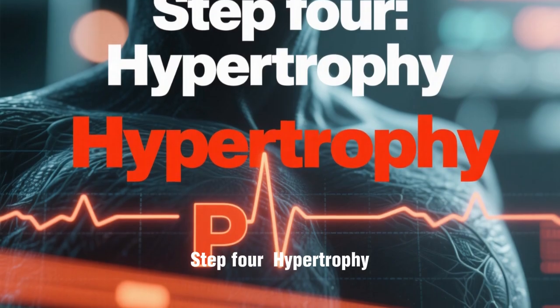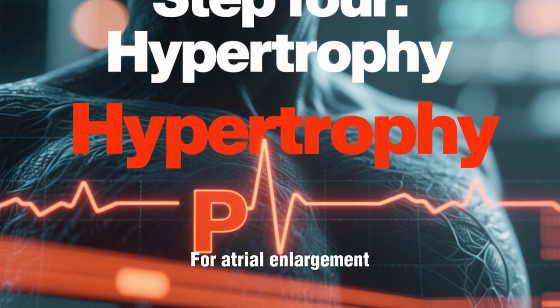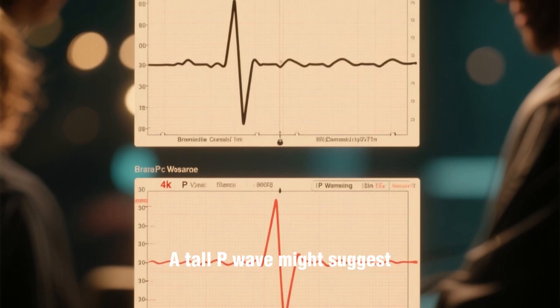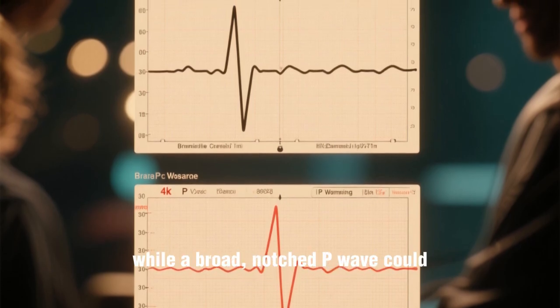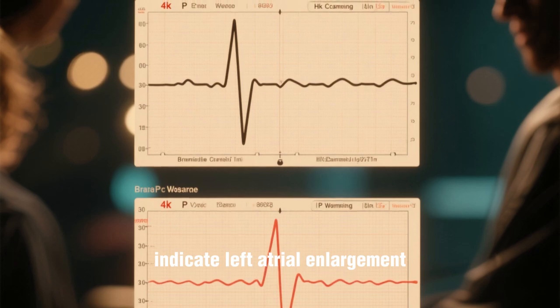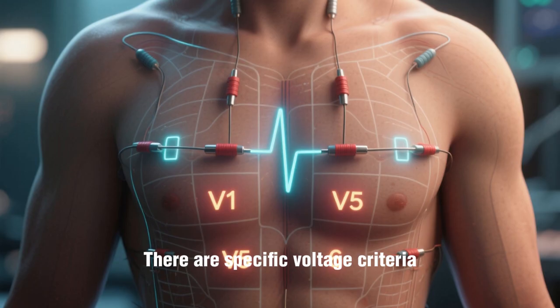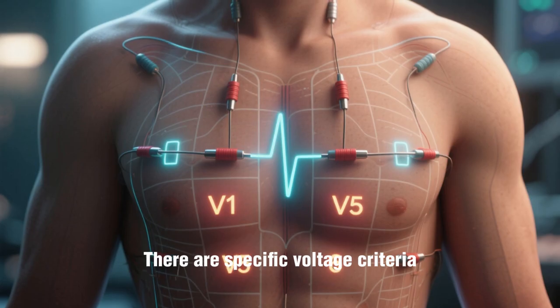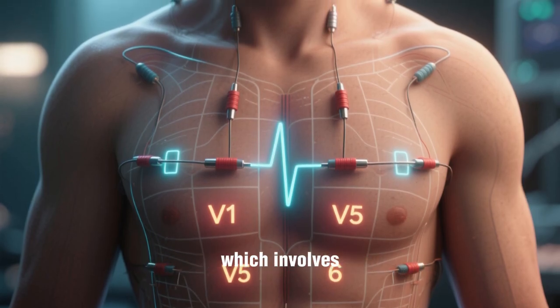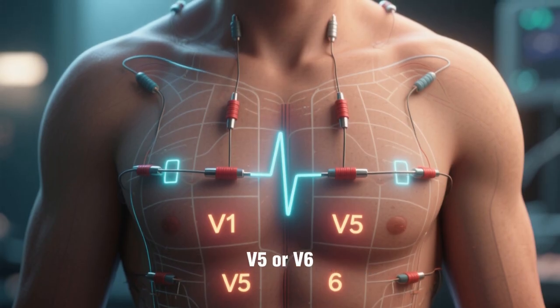Step 4. Hypertrophy. Is there evidence of chamber enlargement? For atrial enlargement, you look at the P wave. A tall P wave might suggest right atrial enlargement, while a broad, notched P wave could indicate left atrial enlargement. For ventricular hypertrophy, you look at the QRS complex. There are specific voltage criteria, like the Sokolow-Lyon criteria for left ventricular hypertrophy, which involves measuring the S wave in V1 and the R wave in V5 or V6.